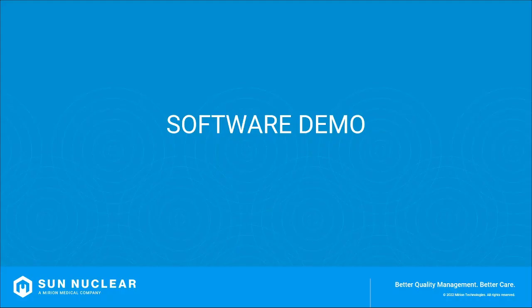So let me just jump on to my software right now, to SunCheck, to show you what DoseCHECK actually looks like.